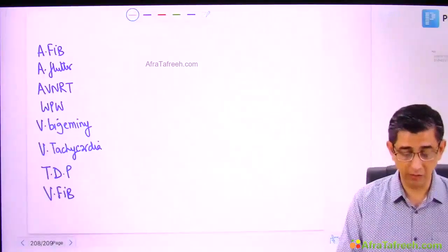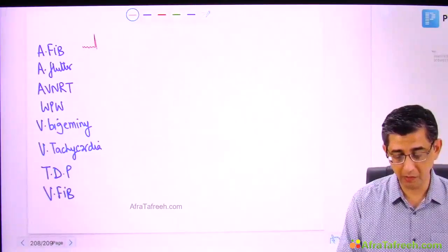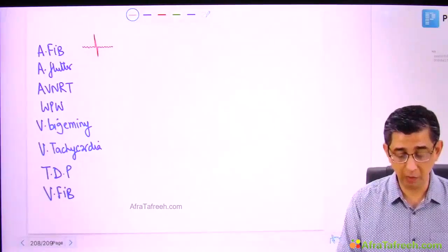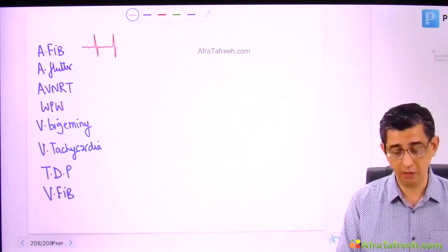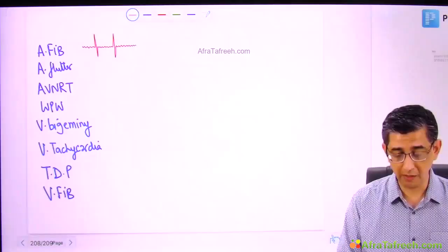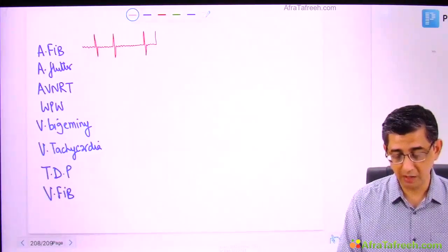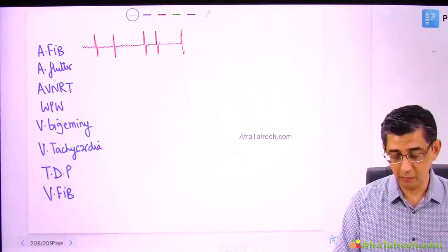But what I want to highlight for atrial fibrillation is that you will notice absence of P waves followed by a QRS complex. In lots of ECGs, even T waves may not be given, or even if they're given, they will be relatively bigger than the twitching that I'm showing. In fact, the highlight of atrial fibrillation, as you can see from the sketches, is that the heart rate can touch normal, and then you can notice the acceleration. The main highlight of what I've at the moment sketched before you is the irregular RR interval.